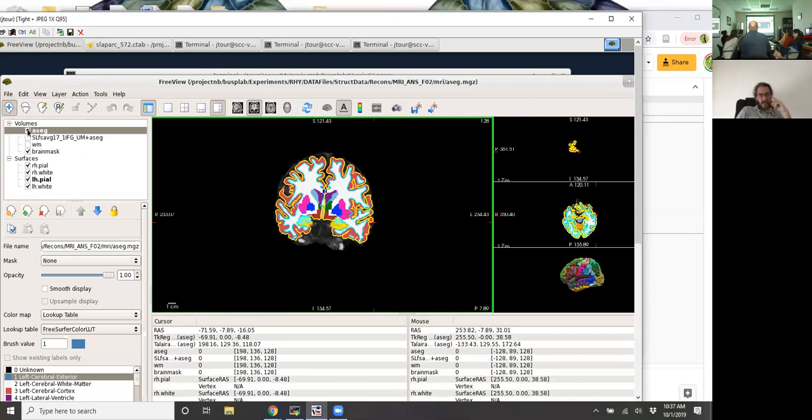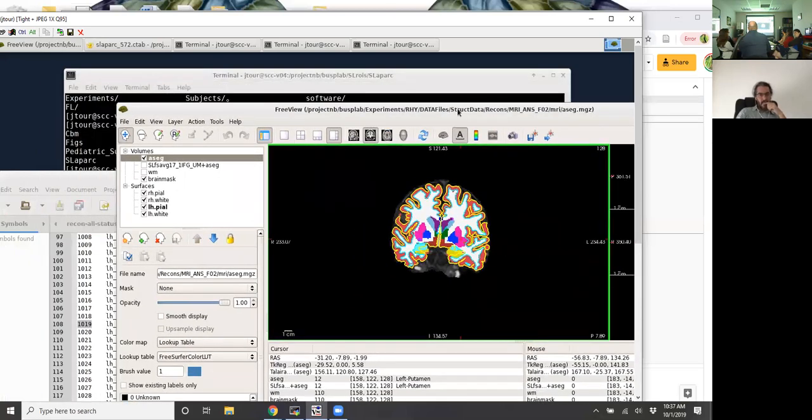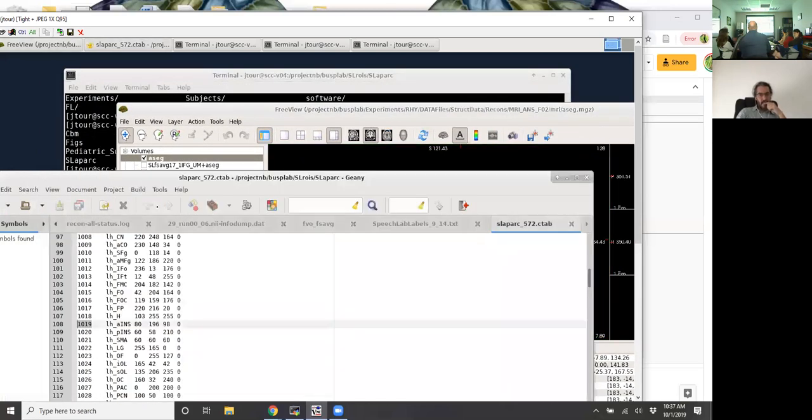Okay, so last here. Then I just loaded up Freesurfer's automatic ASEG. And if I click on something in here and I look down at ASEG, I see what the value is. So that 12, so is the Freesurfer automatic labeling meaningful? Let's go look. Let's see what 12 is in here.